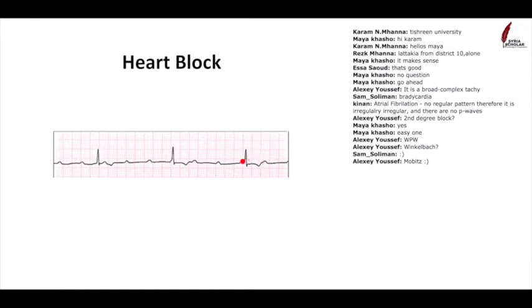It's just completely disconnected. So you have a P wave right next to the QRS, whereas here you've got a P wave with a massive gap before the QRS, and here you've got a P wave with no QRS. So it's completely detached. The atria are depolarizing, and the ventricles are depolarizing totally separately. It means none of the electricity from the atria is getting through to the ventricles. And when that happens, the ventricles have their own kind of backup system. You have your atrioventricular node, which will depolarize by itself, and the ventricles, which will eventually depolarize by themselves.